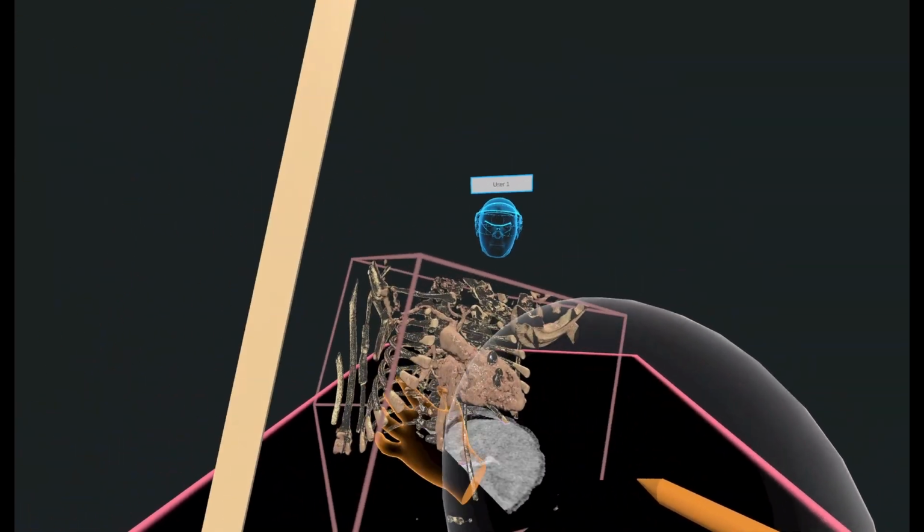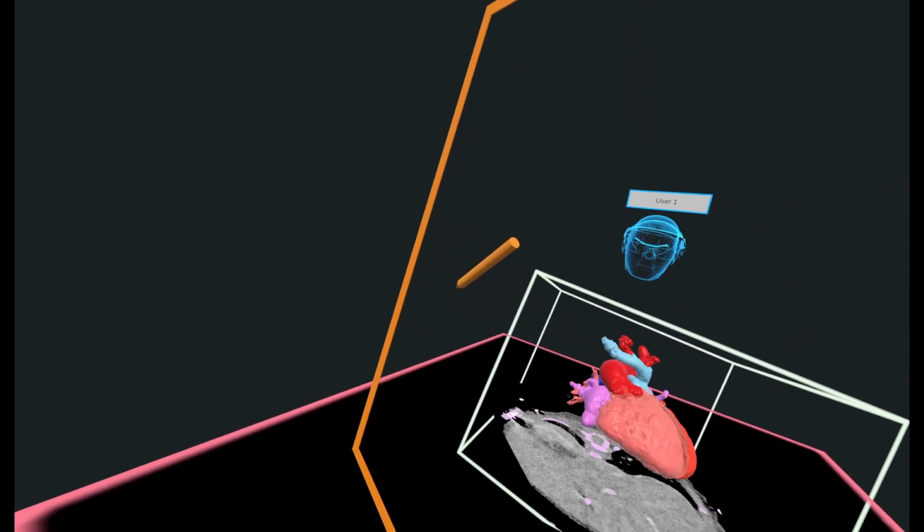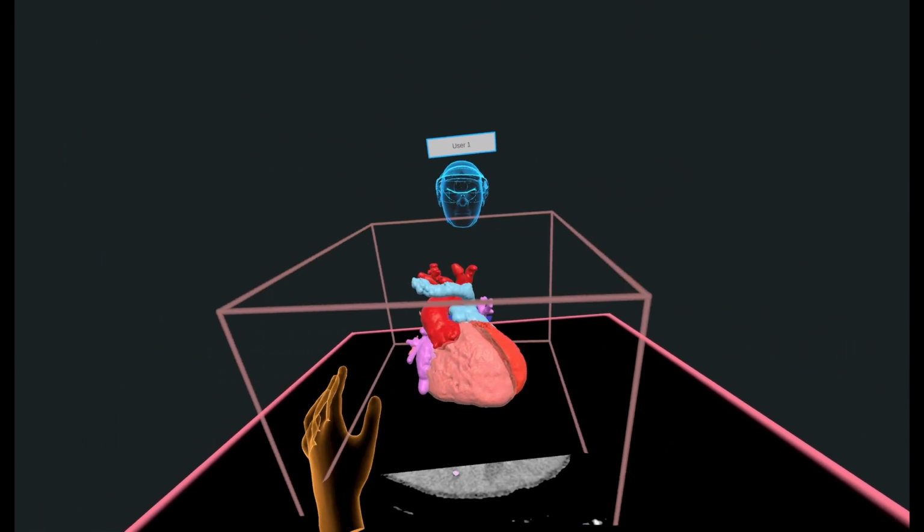And that's the easy way. As you saw, it was a couple of clicks, but I can go back to my model now. And this is going to be exported, can be exported as an STL or OBJ as needed.